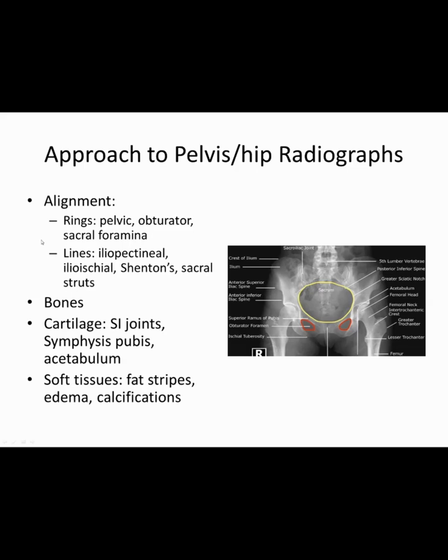I am going through the ABCs approach to radiographic interpretation. I find this mnemonic is helpful for people who are new to image interpretation to help them remember the different structures they want to assess. It doesn't matter how you perform your search pattern as long as you're systematic and consistent once you find an approach that you like. That way it can reduce the chances of missing a more subtle pathology.